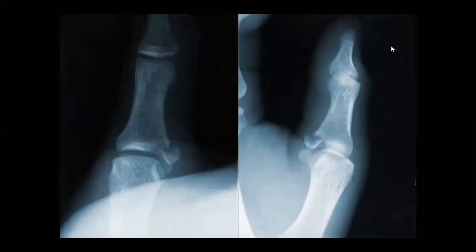Yes. So let's go to the next one. Fracture, trauma: it can come in the exam as short questions, especially the important fractures. One of the common sites to check is the bases of the phalanges, and in the thumb you have the proximal and distal phalanx, and the metacarpal. So you find it easy.